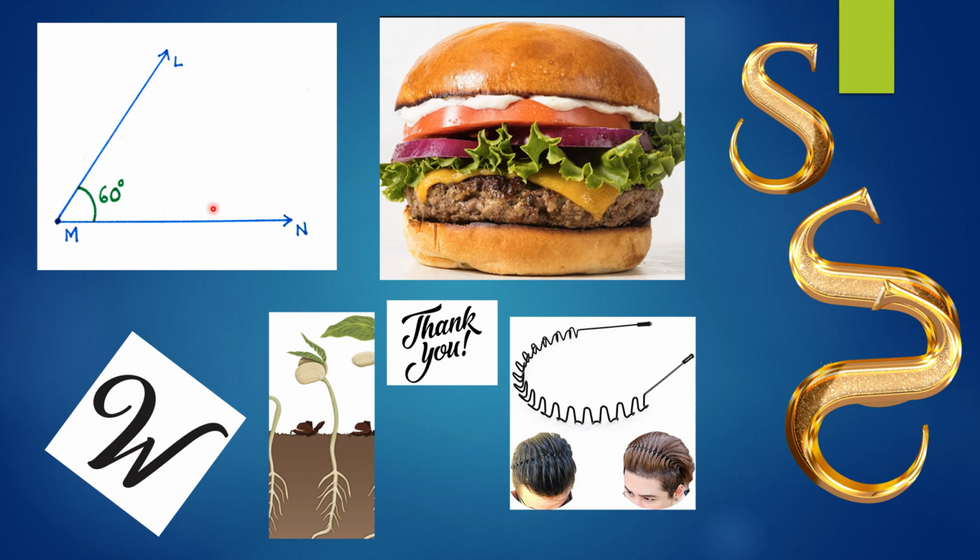So to identify these structures, we'll have to go a little bit systematically because there are like 40 to 50 odd structures which are seen in the limbic system. Start with the collateral sulcus. That is going to divide your parahippocampal gyrus from your fusiform gyrus. Once you identify the parahippocampal gyrus, remember the hamburger. The hamburger had the amygdala, hippocampus, and parahippocampal gyrus.